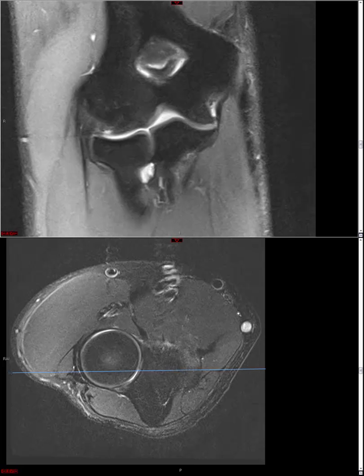So in general, my checklist would include the lateral elbow structures, i.e. the radial collateral ligament, the lateral ulnar collateral ligament, and the common extensor tendon. Then on the medial side, I would look at the anterior bundle of the ulnar collateral ligament. We'll talk briefly about the posterior and transverse bundles, although that does not form a major component of the analysis. And then the common flexor tendon also on the medial side.